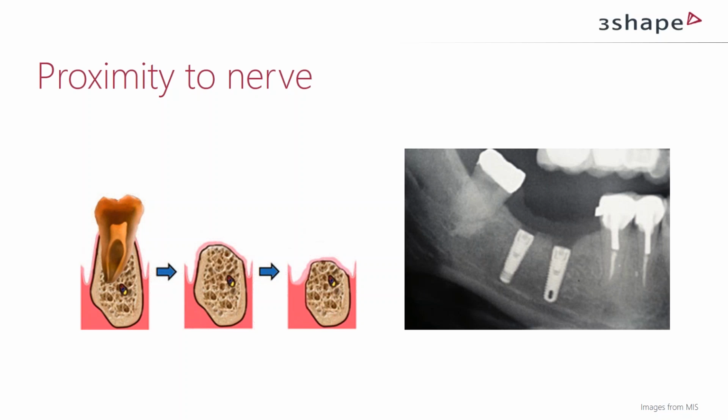Sometimes you don't need to go into the nerve, only the proximity to the nerve. The bone being heated up by the drill, or the forces expanding the bone in that area when placing the implant, can give cause to sensitivity problems in that area. So I guess this also means that replacing removable prosthetics with implant prosthetics in patients who have had a removable partial denture or a full denture for many years becomes a practical problem that needs to be solved by the surgeon.